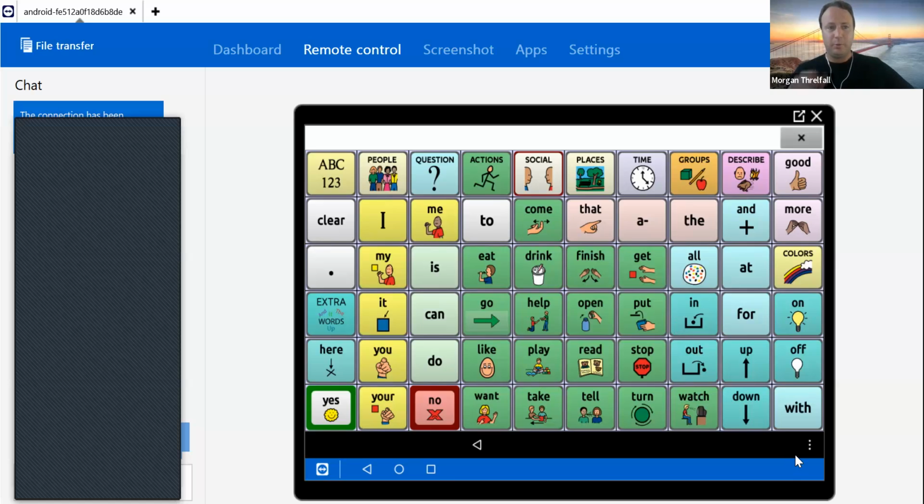When we're trialing WordPower and devices, or if we have a long-term AAC user, there are some features on the device which will show you what are the words that the person is using, and that's called data logging. On the NovaChat, the Rugged, and on the iPad with TouchChat, you can record what words your student is saying. That's really handy for when you're applying for funding, or if you're trying to check whether your student is achieving your therapy goals.